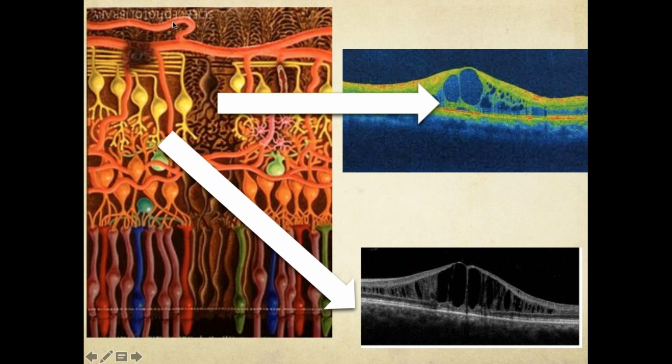So it depends upon whether the edema has split it vertically or horizontally. Horizontally, it might not be edema, it could be hereditary or genetic, such as hereditary foveoschisis, retinoschisis syndrome, all of these things. So this you need to understand very well.